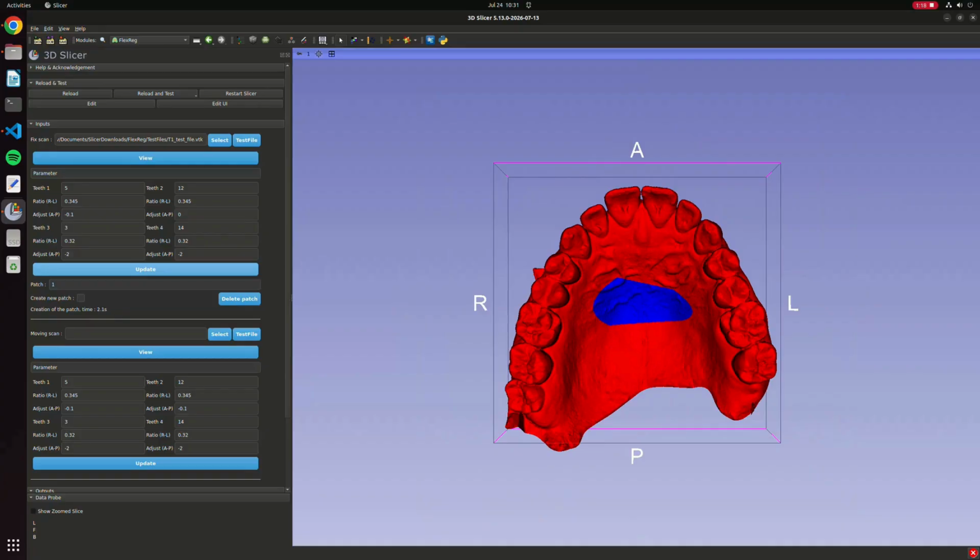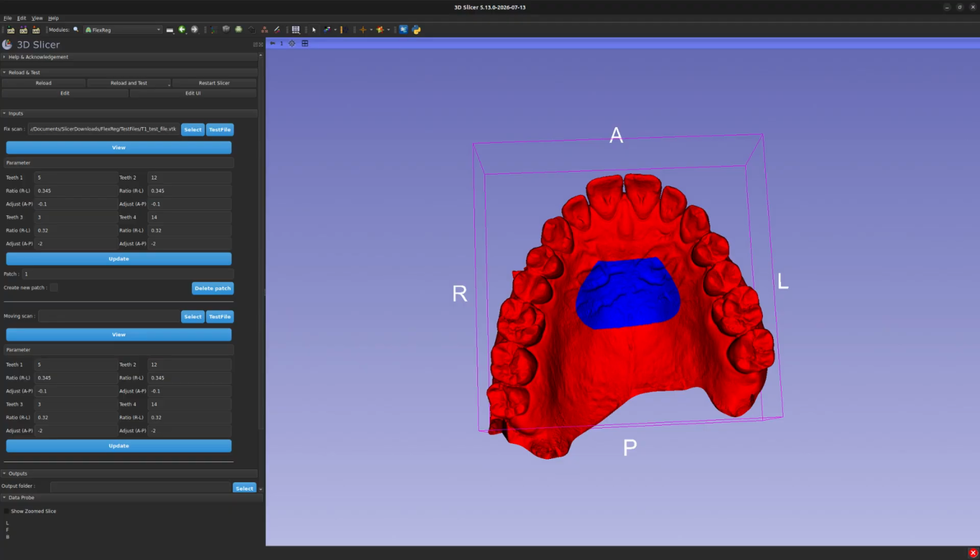This lets you control the length of the patch, extending or shrinking it in the anterior and posterior directions independently, without changing which teeth it's anchored to. Once the 4 landmarks are placed, the tool connects the 2 anterior points with a straight segment, and the 2 posterior points with another. The left and right sides are then closed, which gives the patch its characteristic butterfly shape.